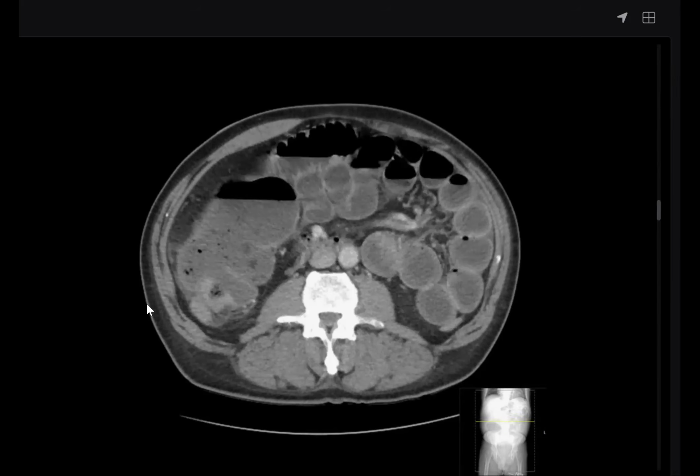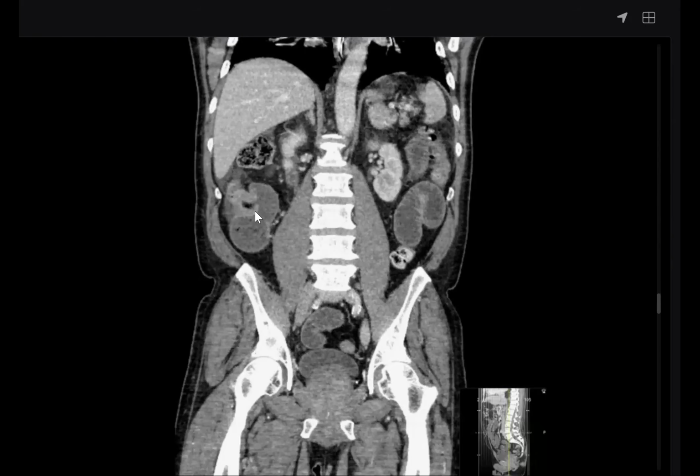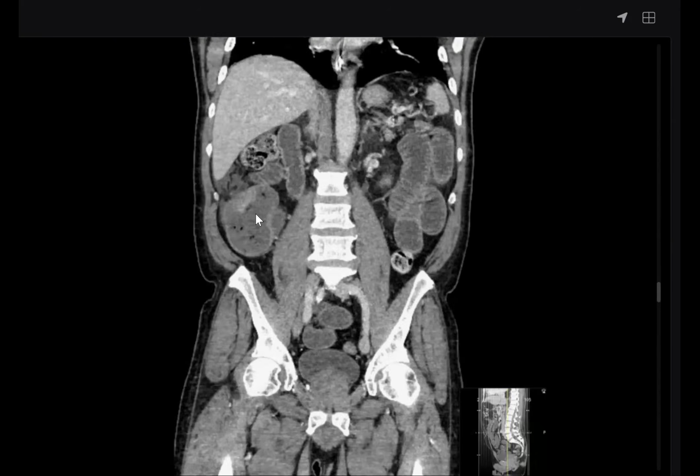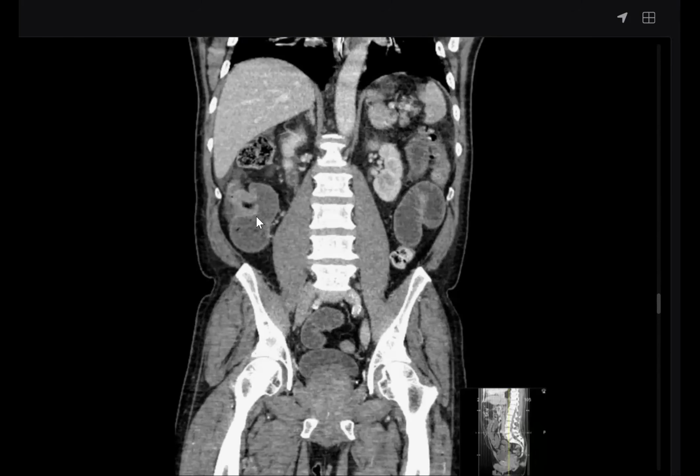So this is likely a neoplastic lesion involving the ascending colon with dilatation of the cecum and the bowel loops. I would immediately pick up the call and inform the referring physician for urgent decompression, and then after the emergency management, refer to the oncological MDT for endoscopy and histopathological coordination.